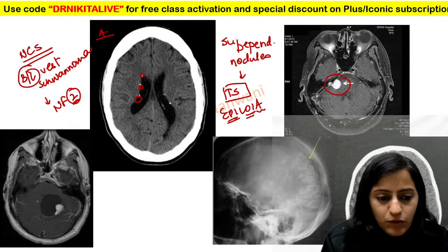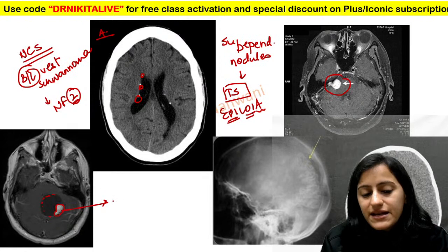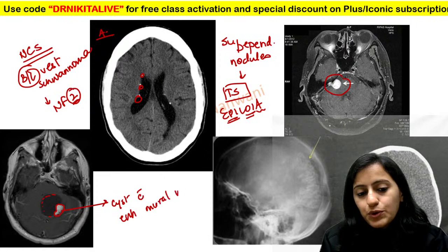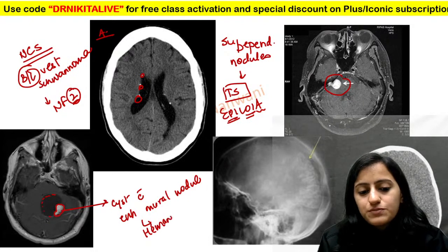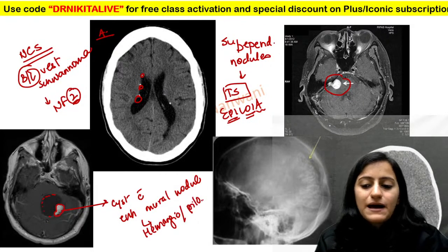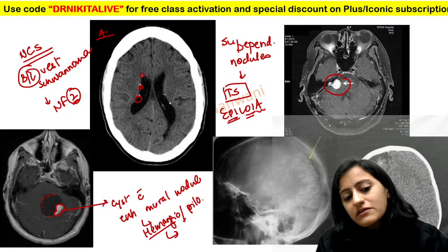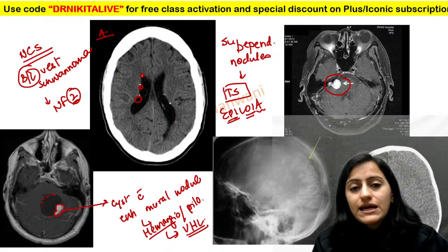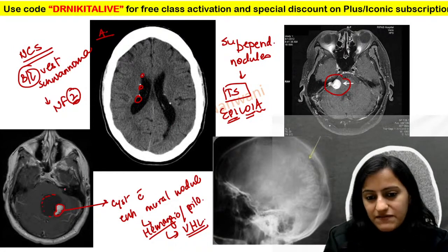Here in this case, what do we see in the cerebellar lesion? There is a cystic lesion. Only this part is enhancing. Along the wall, the nodule is enhancing. So we have a cystic lesion with enhancing mural nodule. You can see the enhancement is only along that nodule, and this is hemangioblastoma. The differential could be pilocytic astrocytoma, and hemangioblastoma is associated with which neurocutaneous syndrome? VHL. We discussed in yesterday's special class. VHL, von Hippel-Lindau syndrome, right? VHL has hemangioblastomas. Very, very important.